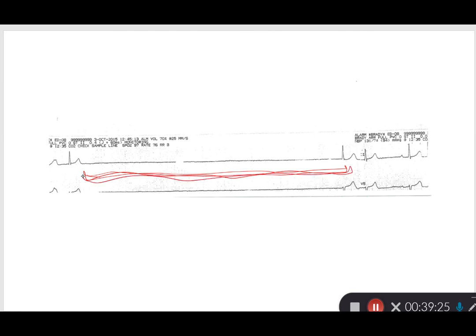We would call that a sinus arrest because it's more than one dropped beat. If it was just one dropped beat, so maybe I dropped one and then went back into a sinus rhythm, we would just call that a dropped beat or a sinus block. But since it's this long period, we call it a sinus arrest. That's probably the biggest sinus arrest I've ever seen.